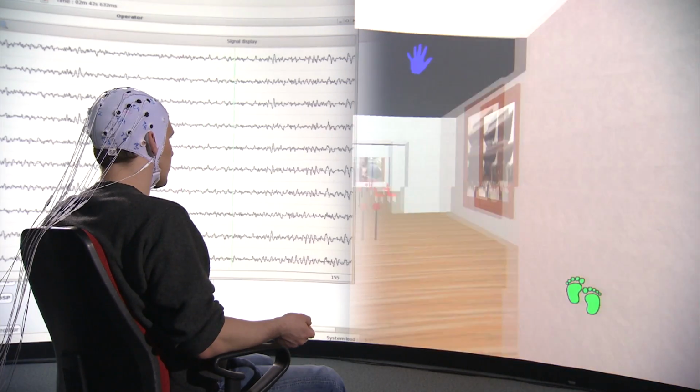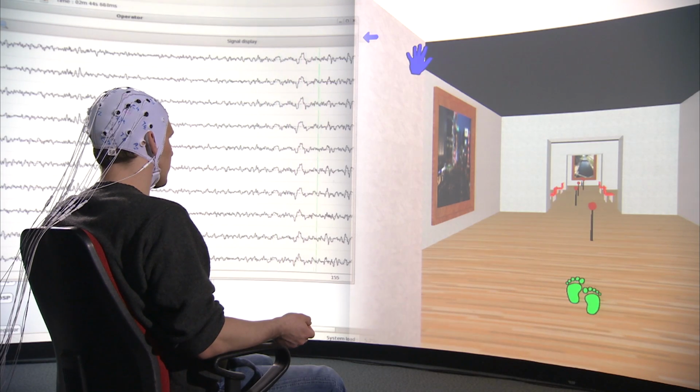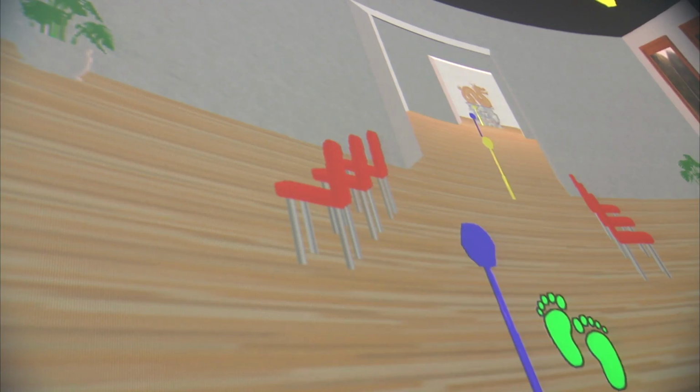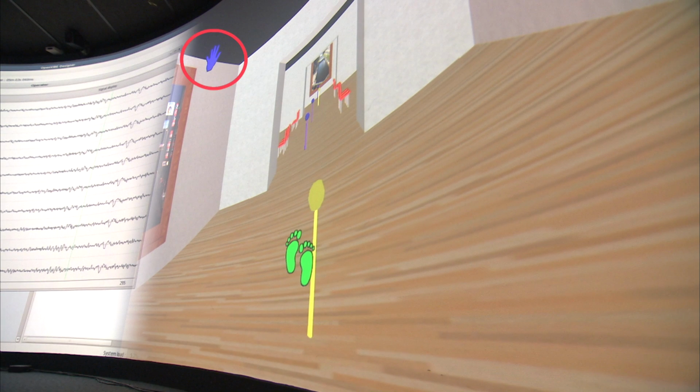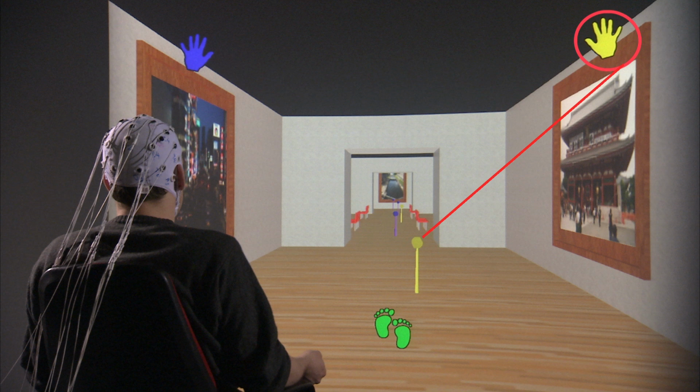We have created a new approach to navigation by thought, which allows the user to speed up his movements by using navigation points derived automatically from the scene to be crossed. With this system, the user must select the blue or yellow points that he wants to reach, while imagining left blue and right yellow hand movements.